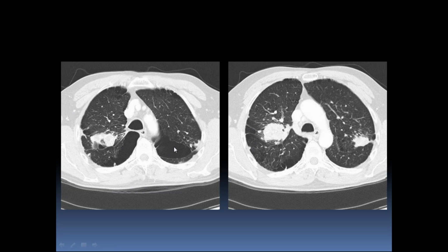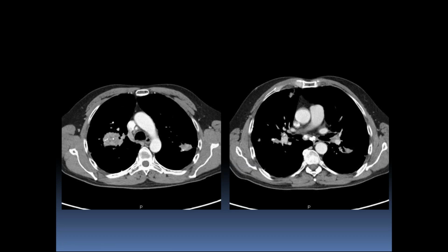So moving on to the same patient into the mediastinal windows, you can see that in the area of the progressive massive fibrosis you have areas of calcification. Now, it's not 100% diagnostic because they do say that bronchogenic carcinoma can engulf adjacent calcified granulomas, so it is possible that you can get calcifications within carcinoma, but one of the other things that you typically don't get is the cicatricial emphysema.